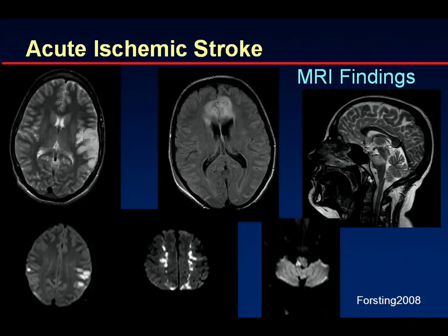This is not a classic infarct, but a secondary infarct in a patient who had an aneurysm of the anterior cerebral arteries that had been clipped. Actually, it had been clipped successfully. The arteries were still open, and then the patient developed a vasospasm. So the vasospasm caused that infarct, and vasospasm is the biggest problem in the treatment of subarachnoid hemorrhage patients.